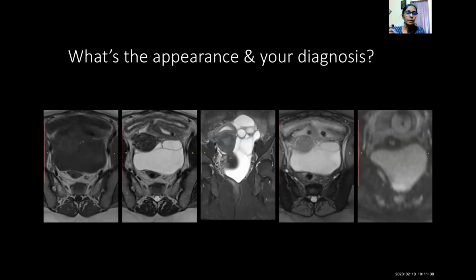This was the appearance on MRI. Can we just, for the sake of going through it, can you go through it, Nick, with me? Yeah.